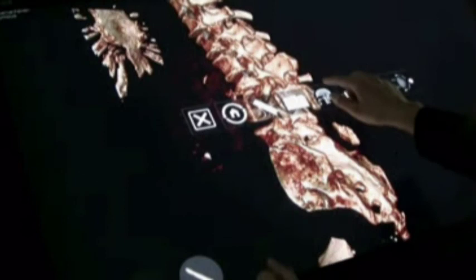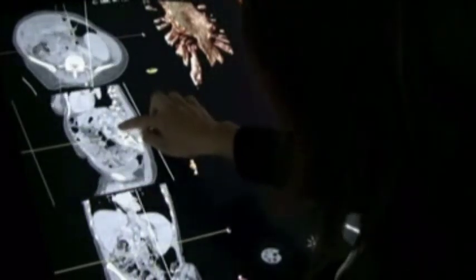Sometimes you want to see the 2D images as well, together with the volume, and that can be done by opening the MPR view. Now we have the image stack in 3 different projections: the axial, the sagittal, and the coronal view. I can scroll into the stack by either using my fingers, like this, or using the thin lines here.